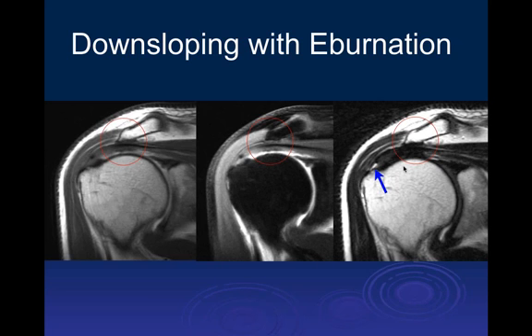It depends on the age of the patient. Most partial tears occur in athletes, as you know, John. Yep. And they are joint related.